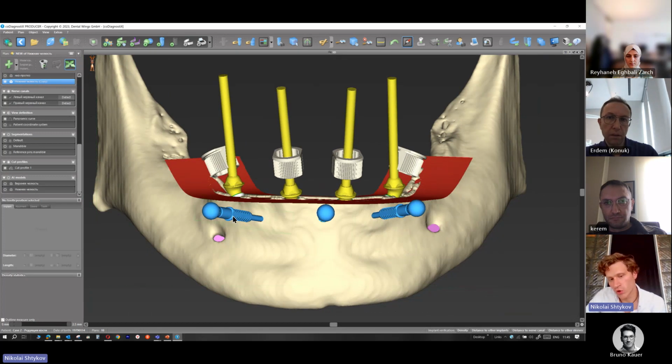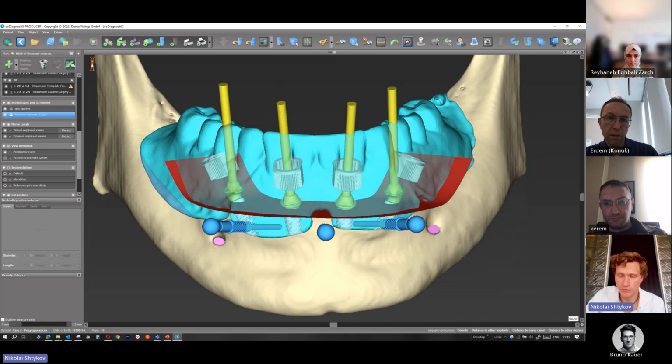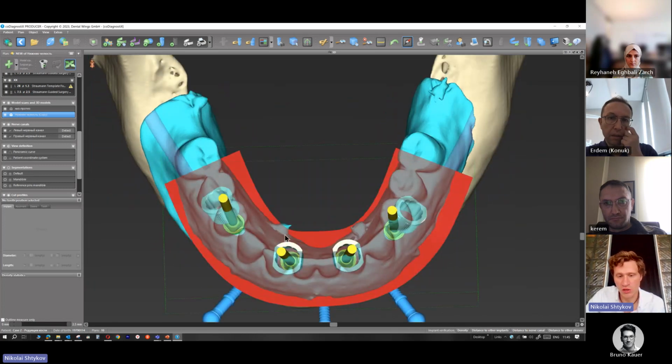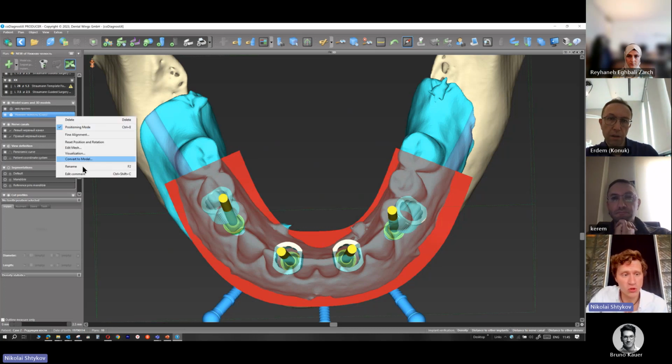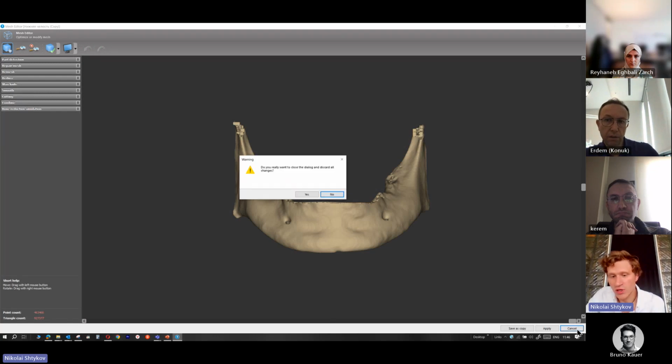First, the guide for the pins, how to do it. For this guide, I will use this prosthetic. This is not an artifact, this is the CT spots, but maybe I want to smooth these spots, though it doesn't need to be done every time.